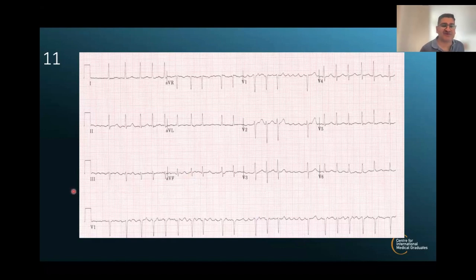And again, I want someone to talk me through the ECG, but this is an 83-year-old lady with symptoms of dysuria, frequency of urinary micturition, and a new onset of confusion. The patient has a urine analysis that is positive for nitrites and leukocytes. And on initial blood tests, the white cell is 18 and there is an elevated CRP. Can somebody talk me through the findings on this ECG using our stepwise method, please? Someone new again.